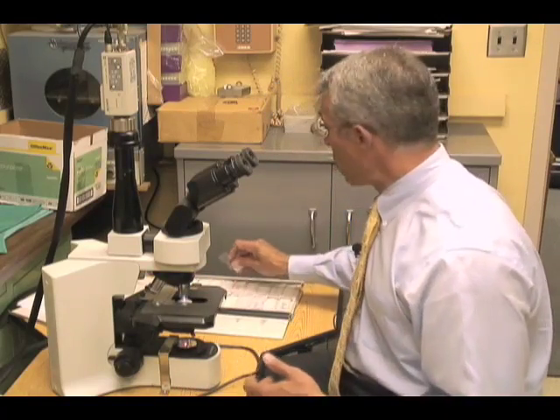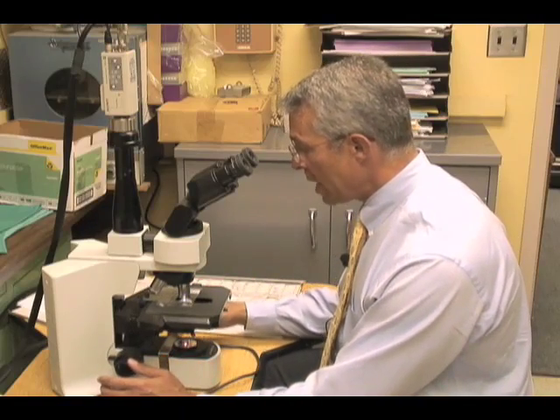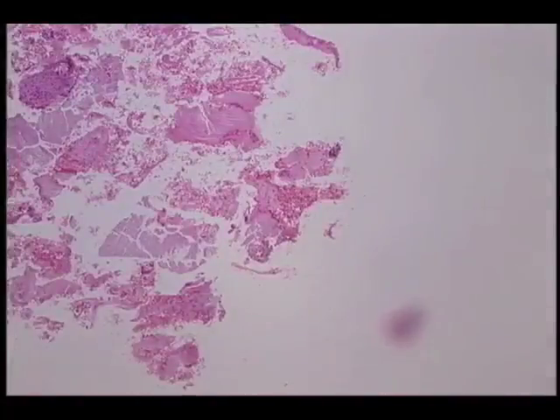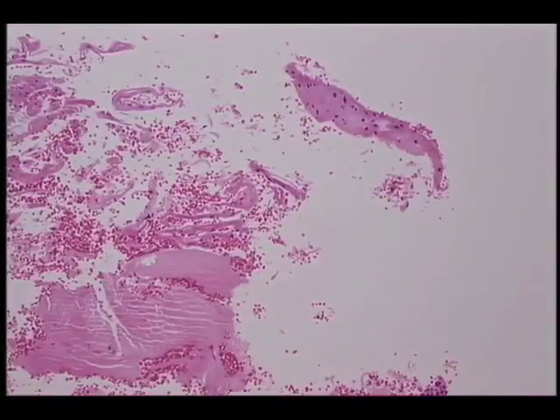Examination of these specimens is quite easy. Again, as an experienced pathologist, I equate it most with examining an endocervical curettage specimen. And as such, one has to have care to make sure that we examine the entire sample and make sure that we don't miss epithelial fragments that are diagnostic. Again, in this instance, the sample is small, but the pieces of epithelium are quite good. And again, we have here a sample with metaplastic epithelium, and this is again another normal sample.